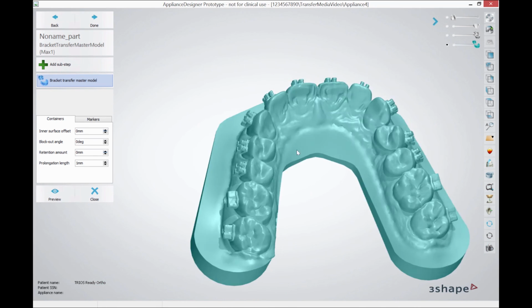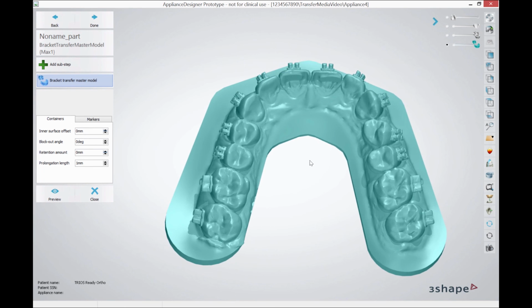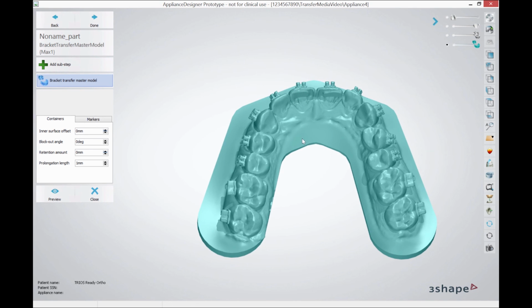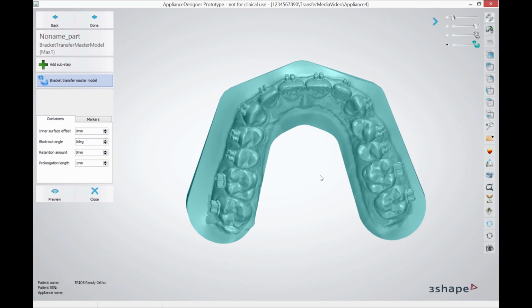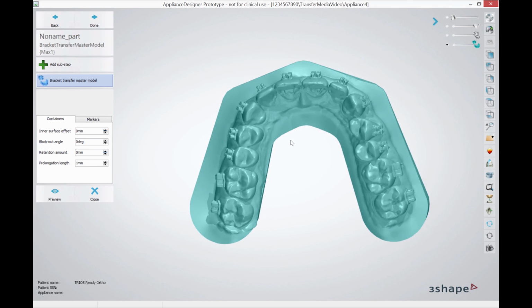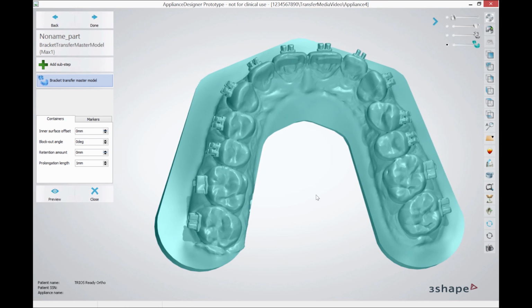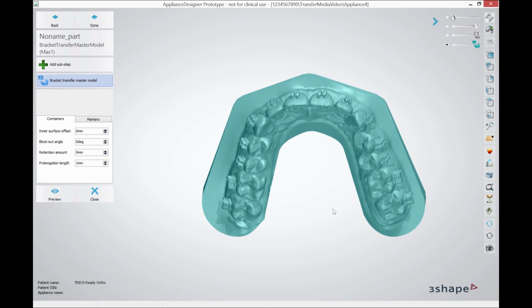Once you have fine-tuned these values, then the next thing is which vacuum pressing sheets you should apply for this. And there I would recommend you to go with the sheets that your reseller of these vacuum pressing sheets recommends for indirect bonding. These sheets have been made and used with big success all over the world for analog indirect bonding, and I would recommend you to go with whatever you prefer there, so you know how the materials are to work with and what works best for you.